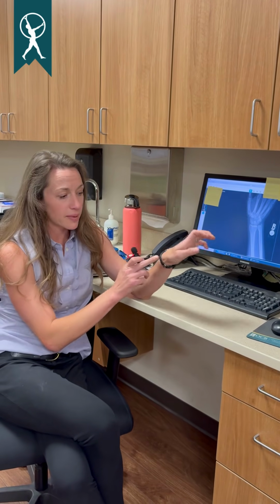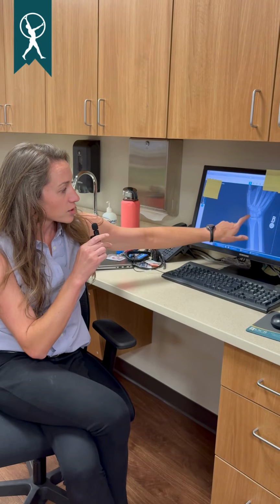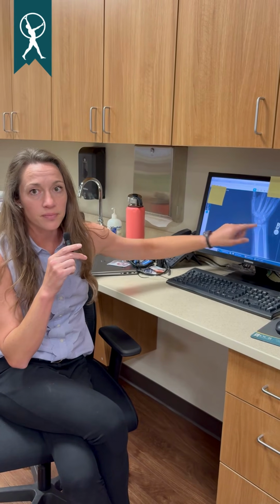Specifically, this fracture is noted by tenderness here at the base of the thumb, and radiographs can show a very subtle fracture right here, very hard to see, but is diagnostic of a scaphoid fracture. If not treated properly, including prompt recognition and casting, this can lead to devastating outcomes, including arthritis at a very early age.